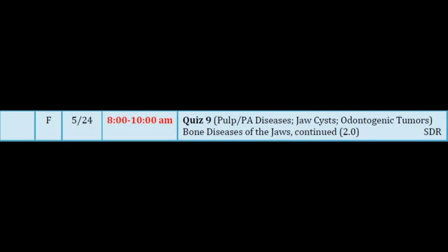So this was a mixed race, African American Hispanic female, 38 years old, seen here at the School of Dentistry. And she had multiple lesions in the posterior mandible and like 1 maxillary lesion that didn't show up very well on radiographs because a student took the radiographs. These things happen. So we decided it was enough to call it florid. We wouldn't call it periapical, so we still called it florid. But you'll notice that the lesions are still opaque in the center with a radiolucent rim, tend to be in the tooth-bearing area. Not so much strictly in the periapical area, but some of them are. And so fits beautifully with cementoosseous dysplasia, not as neat and cleanly into one of the arbitrary types, but it's still a very nice cementoosseous dysplasia.